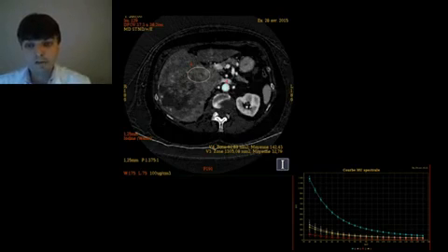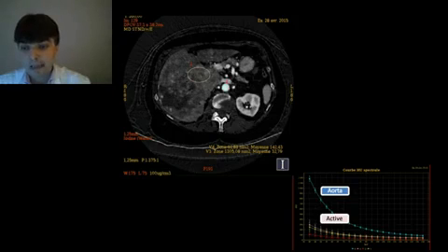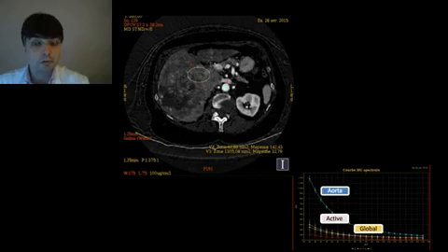Now here, in a very large HCC tumor, we put regions of interest on various regions. We put a region on the aorta, and this is the blue line. So if you look at the way the aorta behaves, that's the attenuation curve of the aorta. Now if you look at the way the active portion of the tumor, that is the tumor that enhances, behaves, there we have the pink line, the attenuation curve. If we put a region of interest bearing the entire tumor, that's the global tumor, we can see that it doesn't show exactly the same attenuation profile.